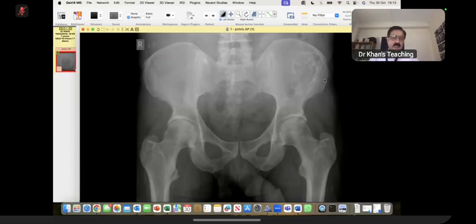They can be ground glass, and they can become more sclerotic than that. And of course, they can be lytic also. So it's not a must that it will be only ground glass. The key finding is the marginal sclerosis. Now, look at how thick is the margin. It is very, very thick. And this is known as rind of orange appearance, quite pathognomonic for fibrous dysplasia and nothing else.